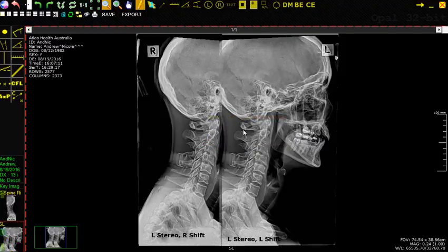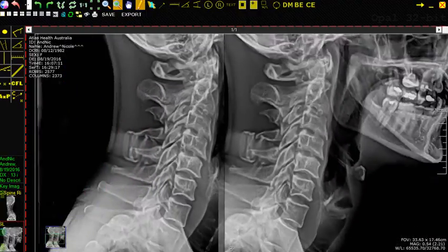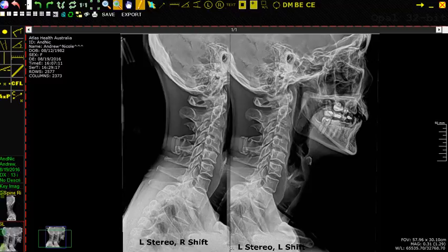Okay, so again, here was the example of the stereos. So just to show you again here, what we can now do is we zoom in at exactly the same point on the left side and on the right side, which is fantastic. The closer, again, that you have the spine to the actual split here, the easier it is to see the stereo image. If you had the spine all the way here, and then the other spot was all the way here, you have to step back really, really far in order to, looking through the glasses, have the two images converge as you're supposed to.